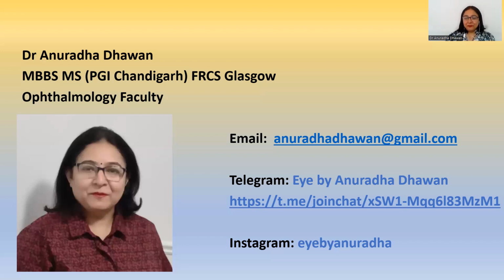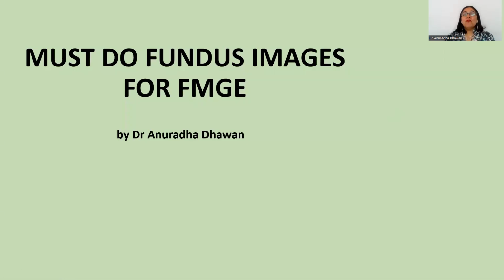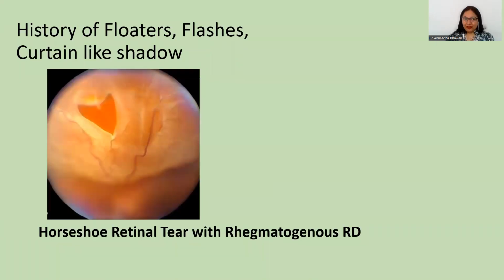So let's begin with our session, in which we are going to discuss must-do fundus images for the FMGE exam. So let's come to the first image here.